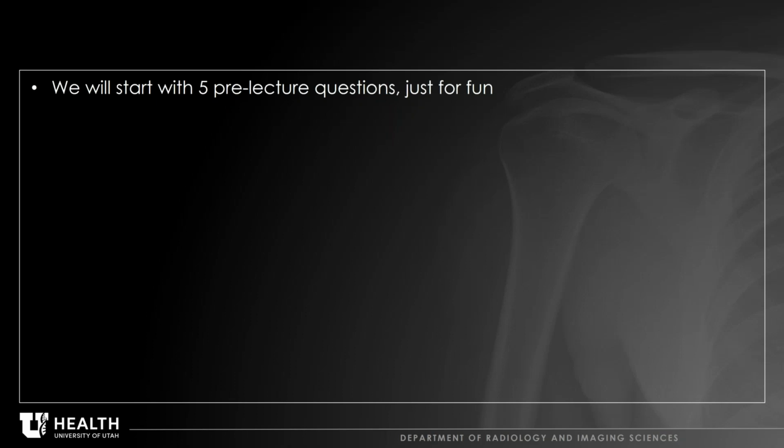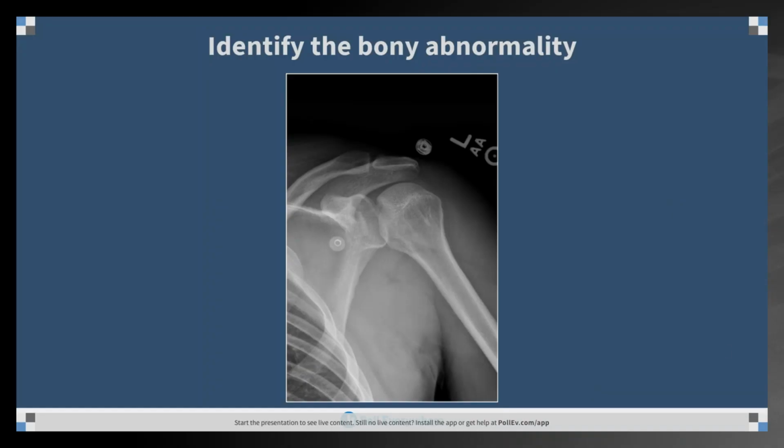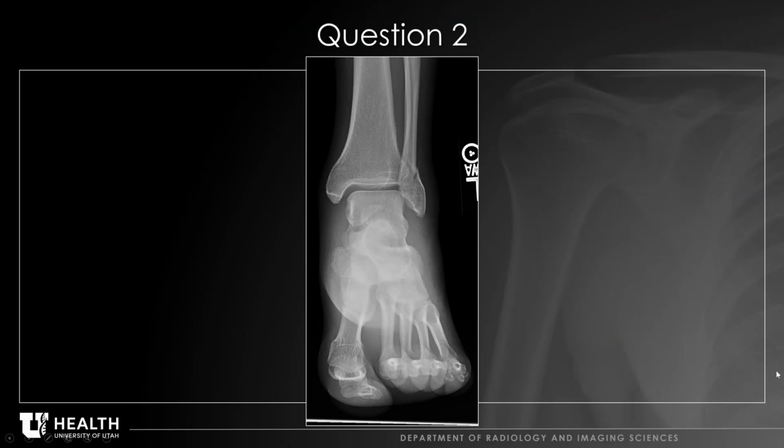These are not the quiz questions for the course, but we're going to use Poll Everywhere. So I'm just showing these images as a beginning, and then here's the Poll Everywhere question. Very touchy today.